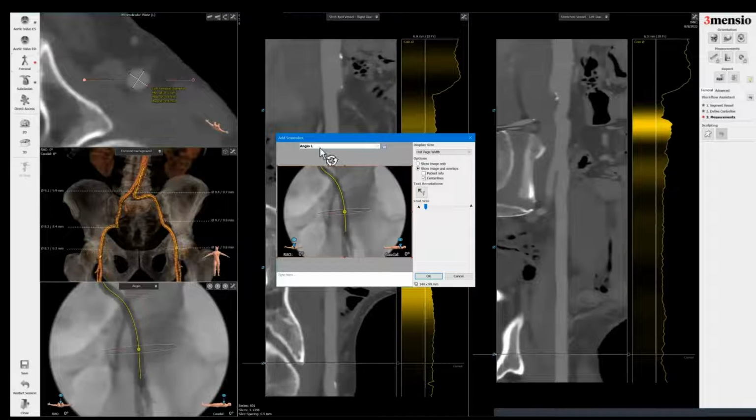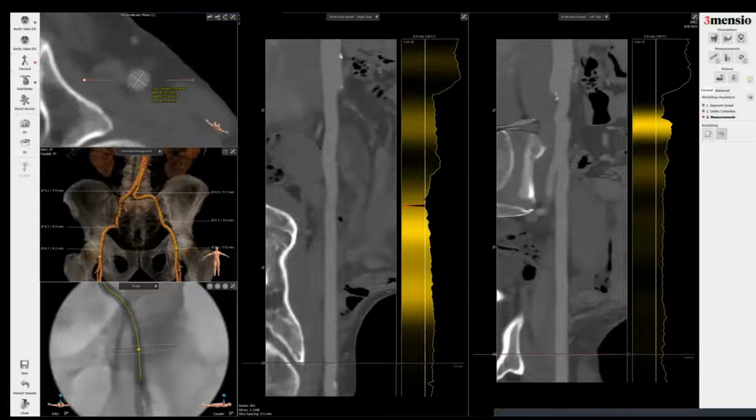This is very important, especially with a high bifurcation or calcified artery. You want to be sure where your stick is. And you can just go back at the time of procedure to the fluoro screen to landmark the same area where you're going to stick. And of course, you can always use ultrasound.